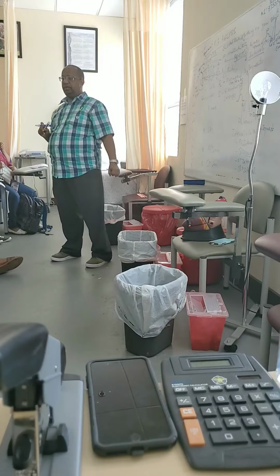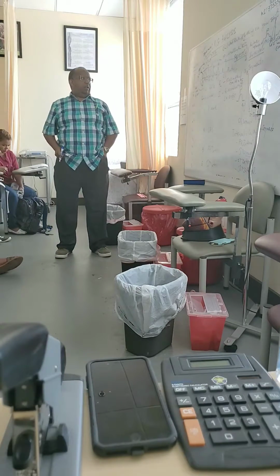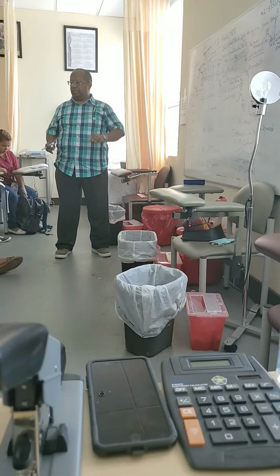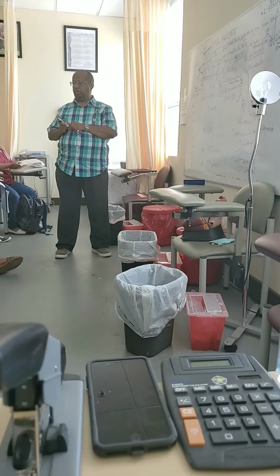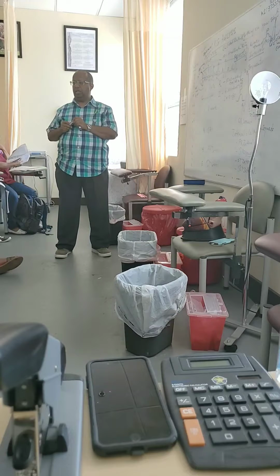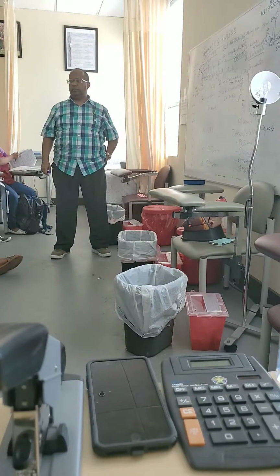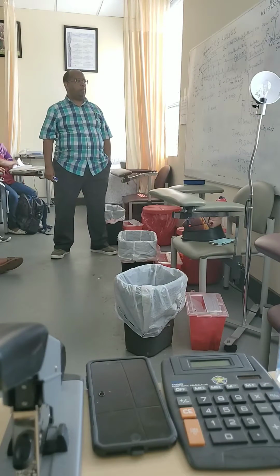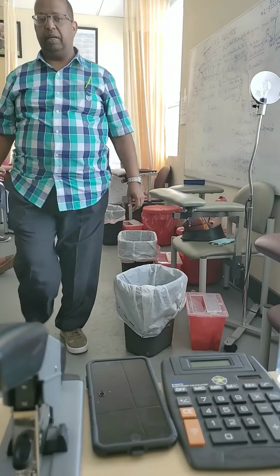When you did the regular 1500 method, where did you get the 20 from? Those are the little boxes. There are little boxes inside it. Yeah, so you count those little boxes from R wave to R wave. Julie, wait. It's from R wave to R wave. Yes, R to R.